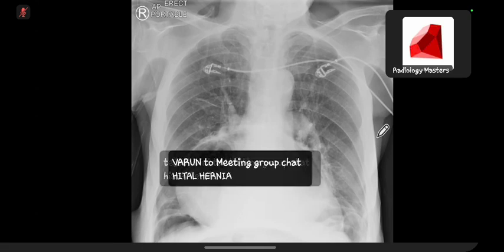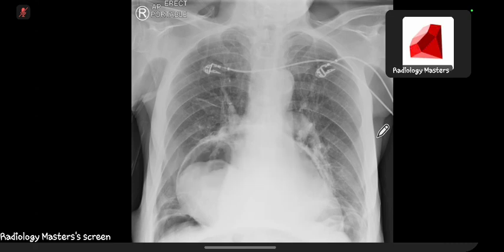You can see both sides of the viscus, which is contained here. And there you go. And we've got the gas within the hiatal hernia. There's the falciform ligament. So it's pneumoperitoneum in a patient who just happens to have a very large hiatus hernia.